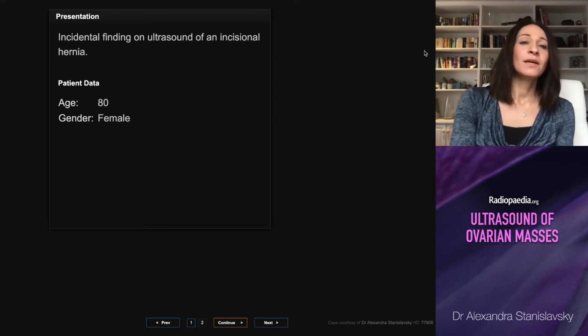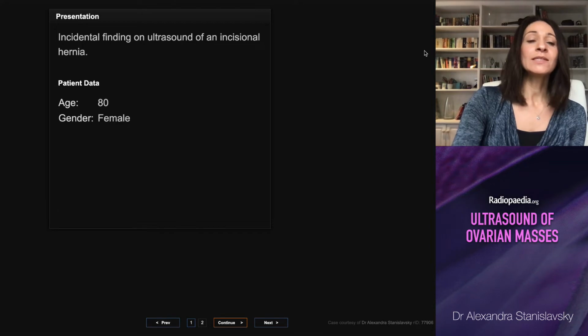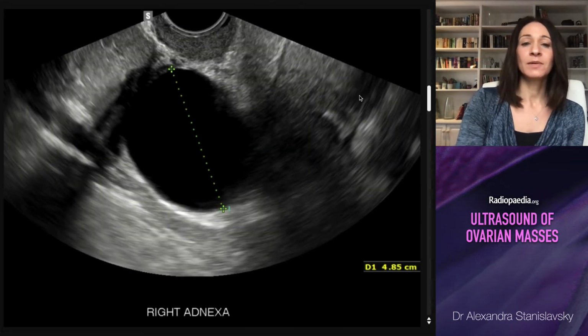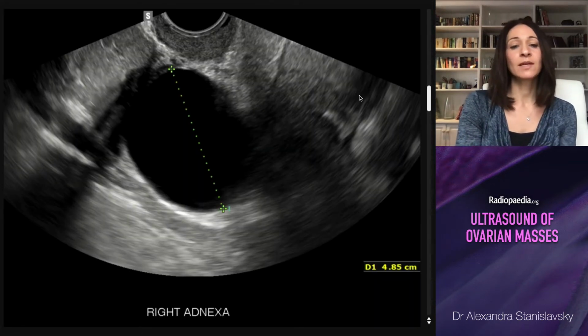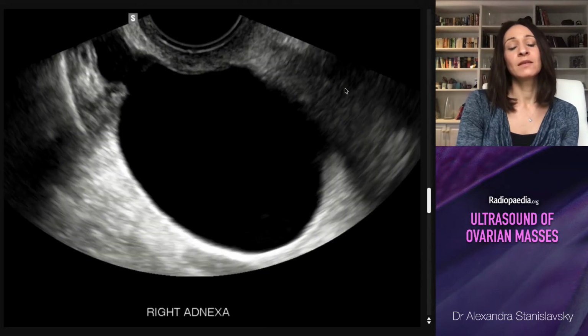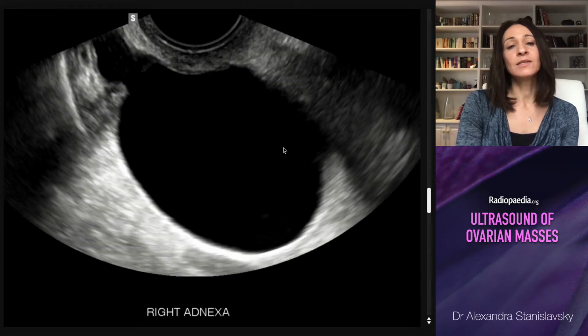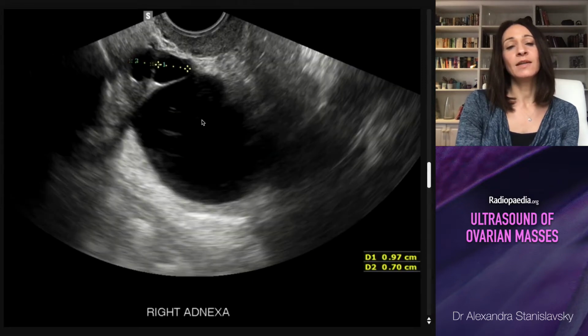First case, an incidental finding on ultrasound of an incisional hernia, in an 80-year-old female. So we're going to review this case first. We see an anechoic lesion.